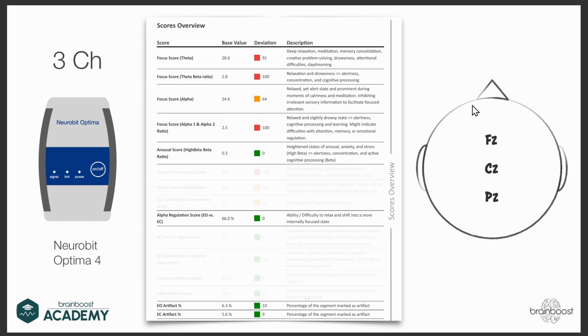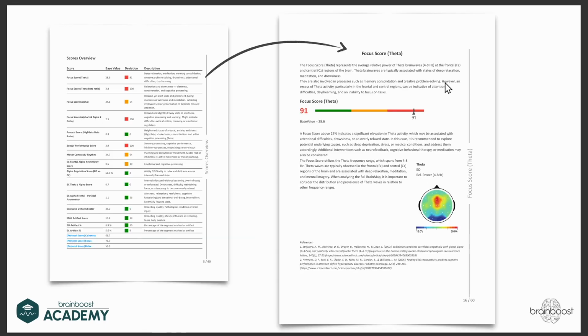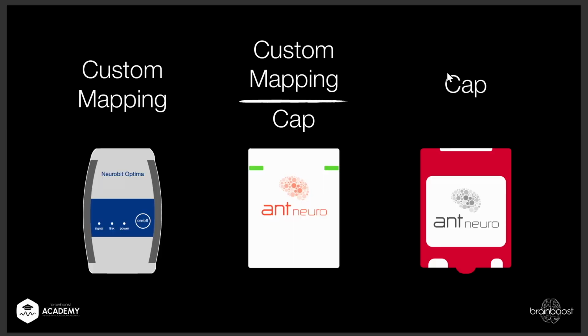And you need an eyes open, eyes closed segment. So if you just have a segment that says training or intervention or something, then the auto report looks for eyes open and eyes closed. So it needs to be named that way. Hope this answered the question. So yes, sure, of course.